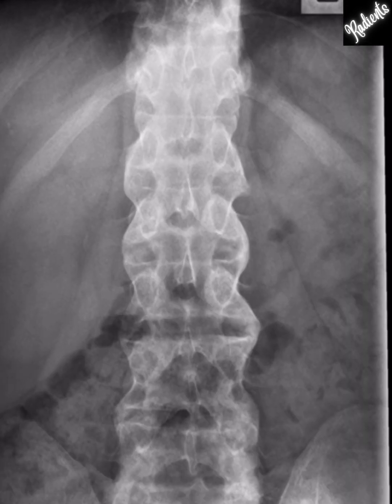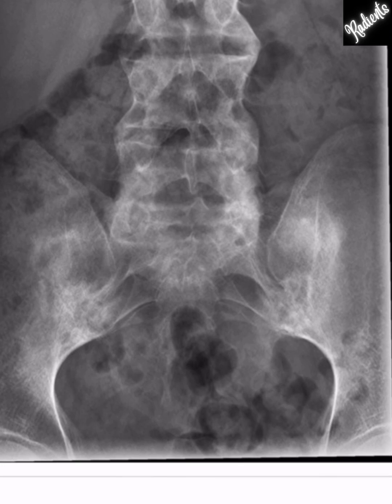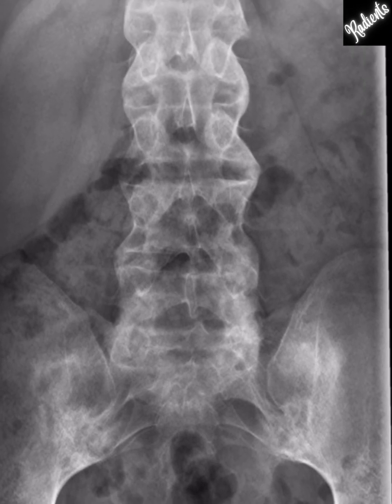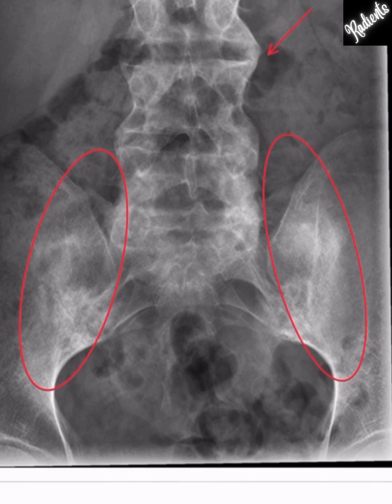Just for a comparative study, you can see here a radiograph in AP view of the lumbosacral vertebrae and the pelvis, where you can clearly see these structures. These are syndesmophytes, as you can see here as well. And if we look at the SI joint on either side, there is no possibility of delineating the SI joint space, because the space has been absolutely obliterated and there is complete ankylosis of bilateral SI joints.